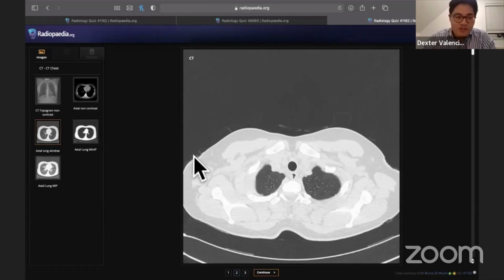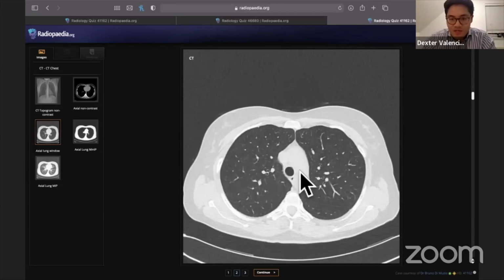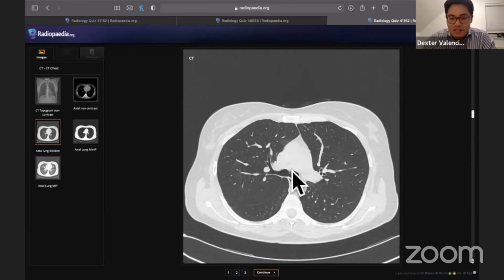So if we just go through some normal anatomy, we can start, say, with an ABC system, so airway. This central round structure has cartilage to keep it nice and round. This is what we call the trachea from your anatomy, and we know that as we come down, it splits in two.